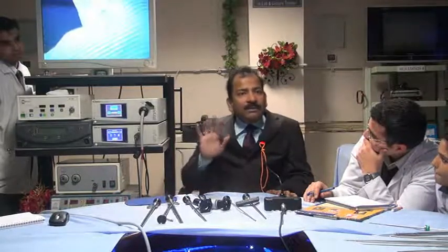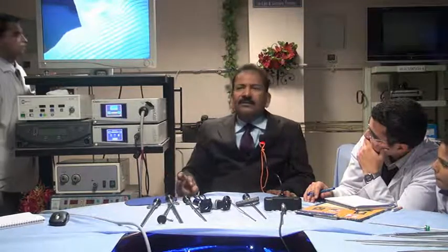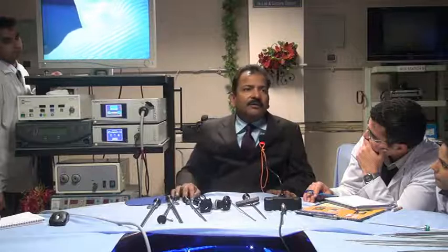Single chip is always good if you have to do a simple surgery, like diagnostic laparoscopy, simple ovarian drilling and all. Single chip is equally good.